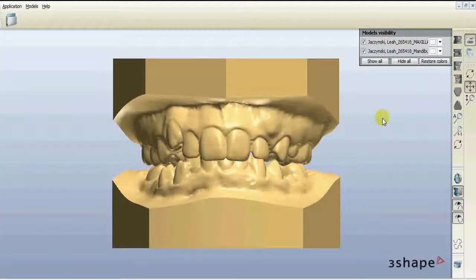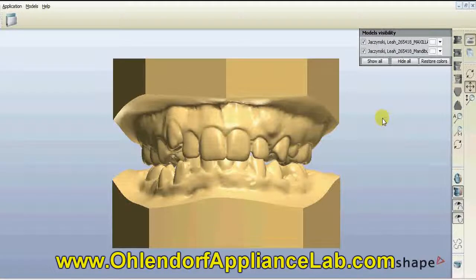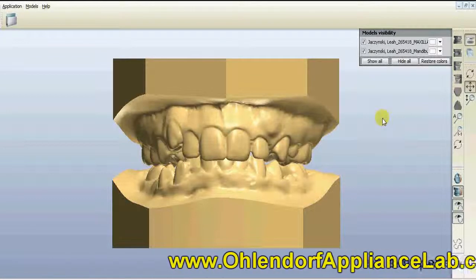In this video, I'm going to show you how to use our new digital study model viewer. I'll point out the many new features that have been added to the latest version. This version's easier to use and has some great enhancements that will help you improve your treatment planning, and it will also help you educate your patients about their case and hopefully improve their treatment acceptance.